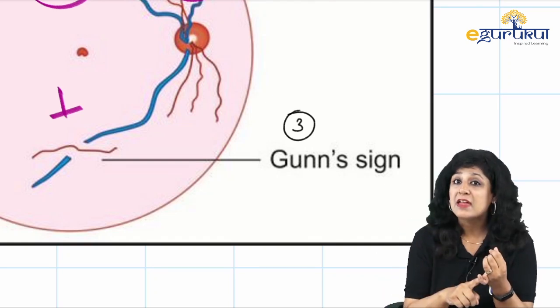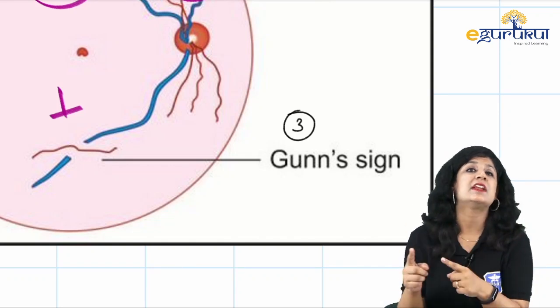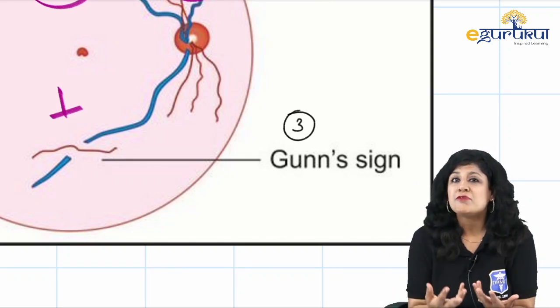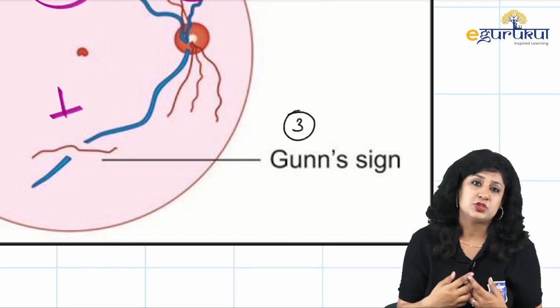What do you mean by AV crossing and why are they different signs? Because they are present at different places. What does this reflect? We have tapering of the veins or the deflection of the veins.